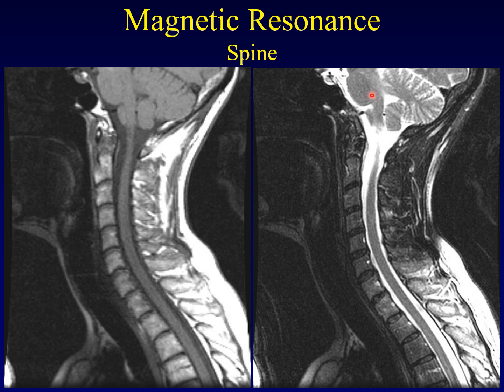The spinal cord might wave from one side to another. Someone might turn their neck or slightly tilt their neck from one side to the other such that the spinal cord, not all of it, is right smack down the midline. And so what has happened here is the spinal cord has taken a little bit of a detour out of the plane of imaging and then come back into the plane of imaging as the brainstem there. This segment is normal cord. You just need to look one cut over from where we are here and you'll be able to see that normal cord. We'll come back to that concept when we do the pathologic images.